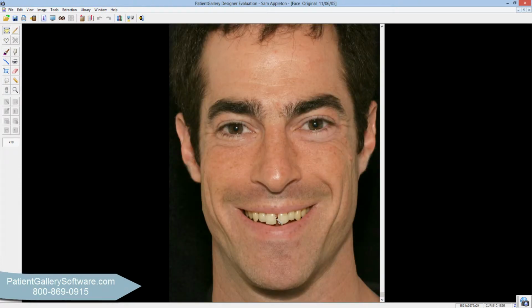I'm going to take my tool here, and we'll get started right away. Okay, let me show you how easy it is to close this diastema.